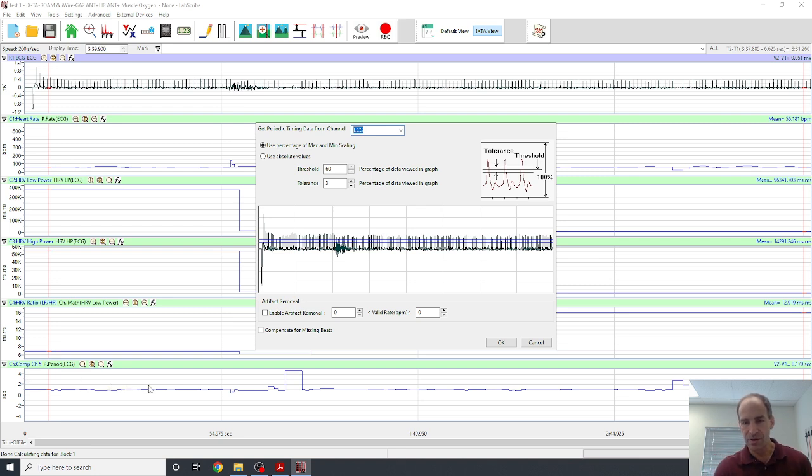Once we do that, you'll notice on the bottom of our data, a new row is going to appear. And when I do this, a new window is going to appear, very similar actually to what we have seen previously. Now, because of the way I set this data up, this looks a little bit different. It's not as zoomed in, but it's the same idea. And in fact, we can actually probably use the same frequency numbers if we'd like. That should get us very similar data.